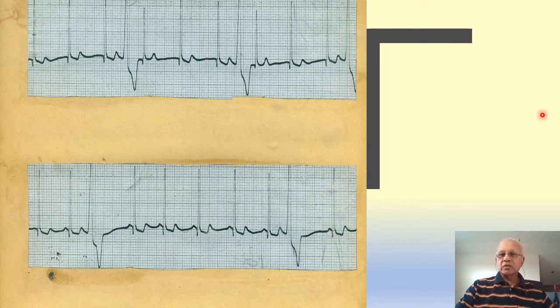Now I asked another question: what is the cause for this arrhythmia? If you look carefully at these beats, the QRS complexes, the ST segments show a downward slope, as if pulling the T wave downwards. This is a typical inverted tick mark appearance of digoxin effect, and in this patient, because of the multiple ventricular ectopics, we will call it a digoxin toxicity, isn't it?